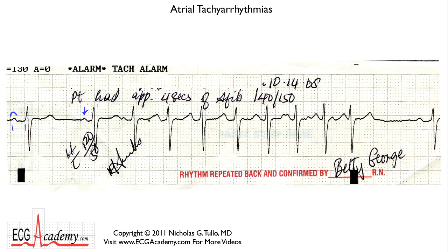You'd expect the next beat to occur in here someplace, but you can see that there's a P wave here that starts off something rather fast. The first beat occurs somewhere above 100 beats per minute, but you can see that there's a slow increase in heart rate. By the end of this, we're talking about just over 150 beats per minute, maybe 155. One thing you can characterize this as having is a gradual increase in heart rate. It's a rapid heartbeat, so it's a tachycardia.